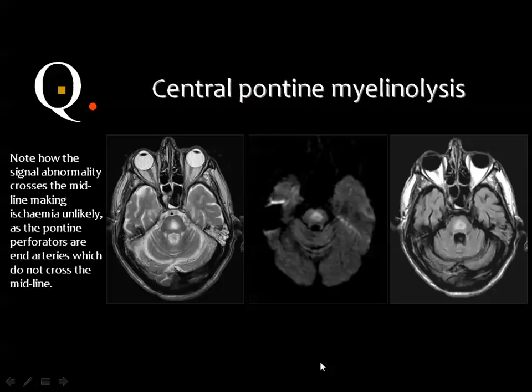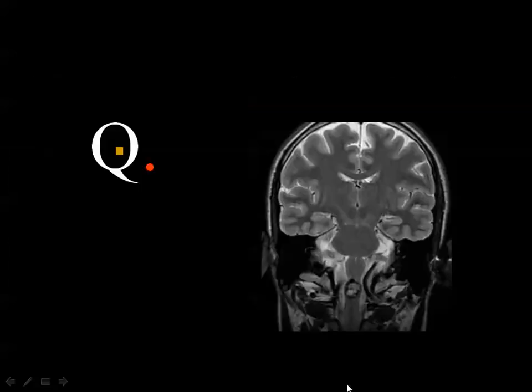I have said just in a moment that central pontine myelinolysis does not show diffusion restriction with few exceptions. Then this is one of the exceptions where central pontine myelinolysis can show diffusion restriction.